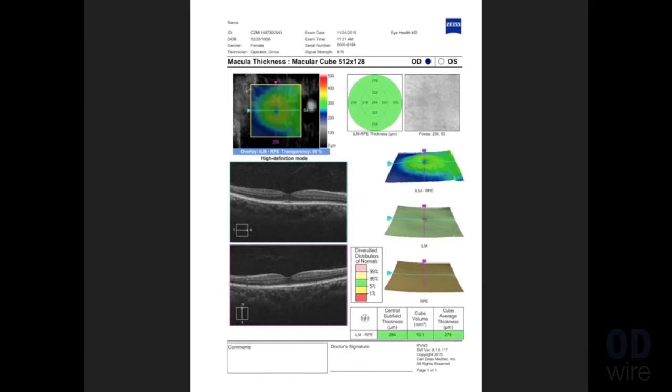Well, this area of qualitative analysis is often best viewed in grayscale, although you will occasionally see it in a colorimetric appearance. ZEISS is one of the few companies that's really gotten their colors correct and provides a very good way to look at it with colors, but as we have learned with further research studies, the grayscale image is really finely tuned for the human eye, and this is now my preferred method for viewing the OCT, again looking at it in the grayscale for the qualitative analysis.